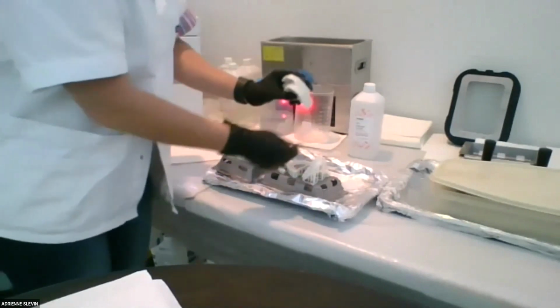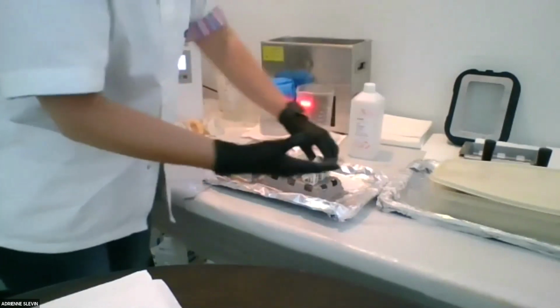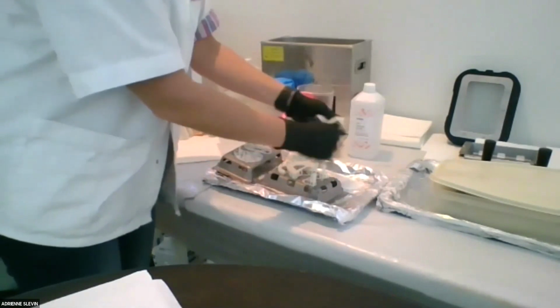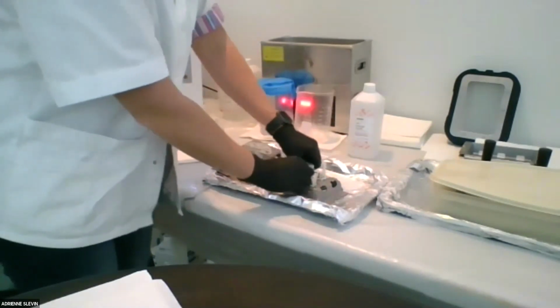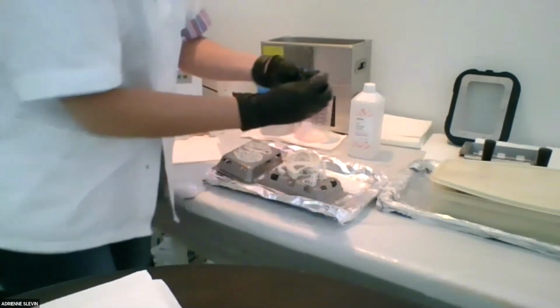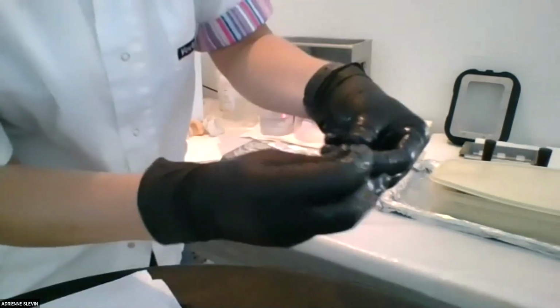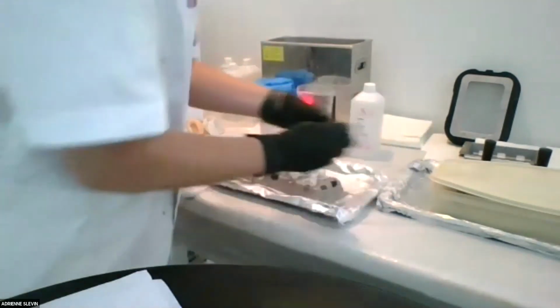Now, if you have bleach or white material, you don't want to put it in something that you've already used, like cast or something that's a little more like a different discolor. You don't want to add discoloration to your bleach colors, okay? So you can see that all you have to do is just kind of rub those supports off, and they just come right off. They're very fine tipped, and if you have the printer, you know.